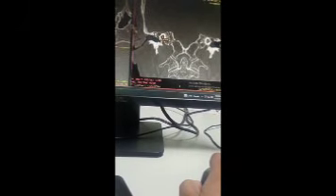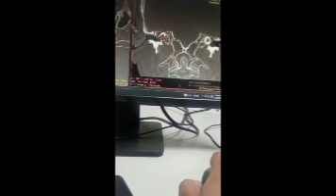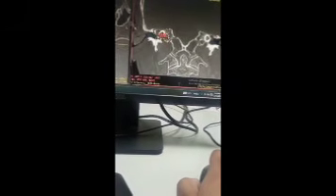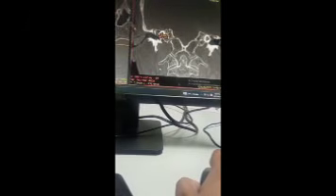Now we will draw another line here. This whole part is the mesotympanum, and this is the hypotympanum, which approaches towards the eustachian tube. Epitympanum, mesotympanum, and hypotympanum. I hope I have made things clear for you.